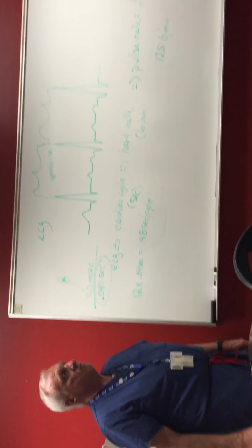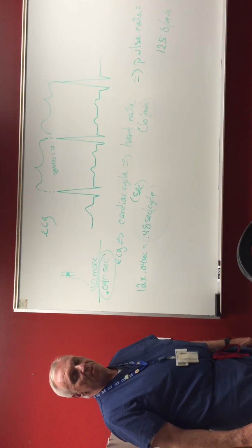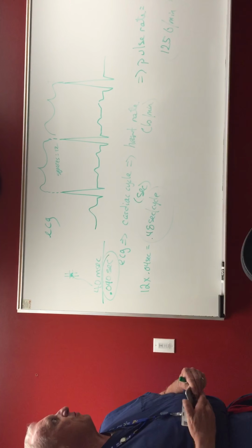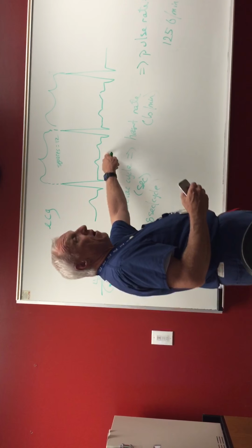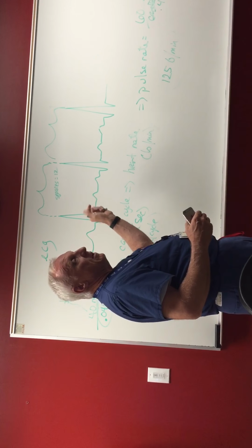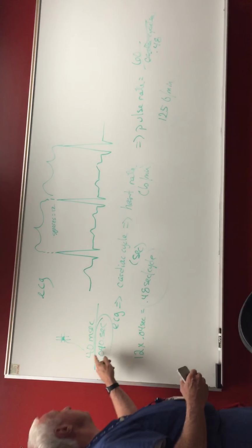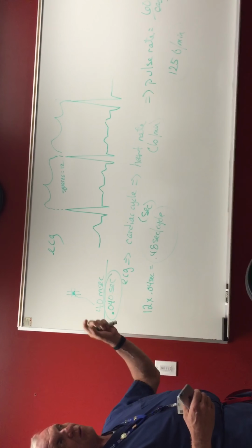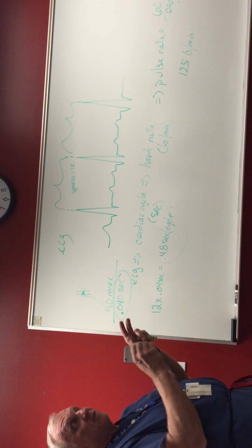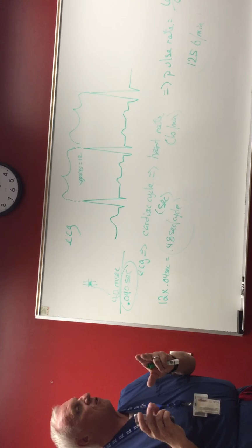Are they always going to be recording at that speed, or does it tell you usually? It will vary, because sometimes if we want to look at small components, we'll change the chart speed that we're printing out, and we'll have a multiplier of 10. So it could be 4 milliseconds per square. In which case you have to know what the speed of the printout is that you've been given.